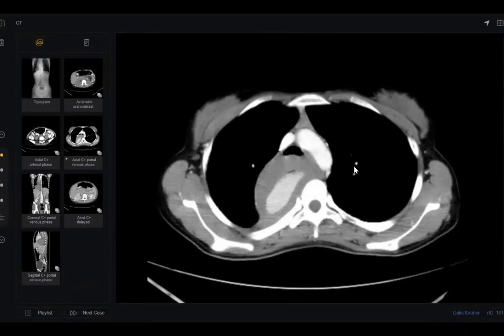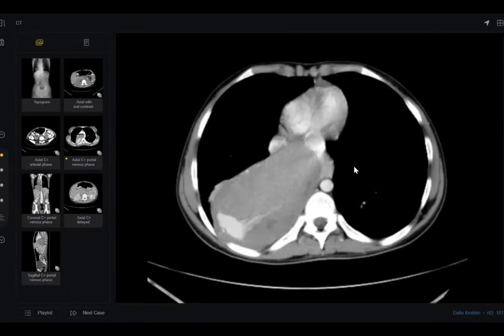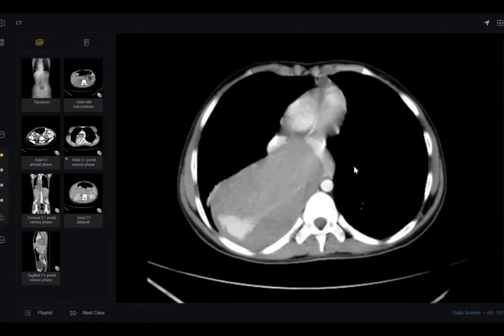So it could be some benign cause. I just want to know if the patient has undergone any operative procedure. We don't know. Okay, so it could be a pull-up surgery as well. If the patient has undergone gastric pull-up surgery, it can also give rise to this finding.